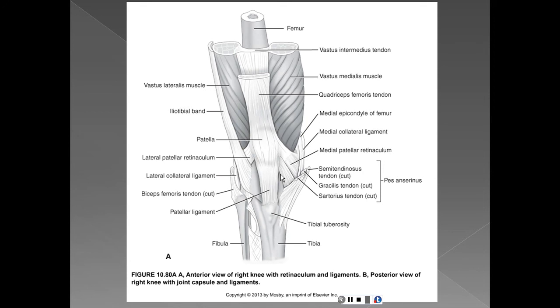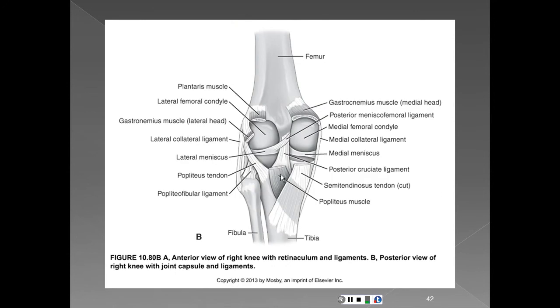This is the anterior view of the knee with the retinaculum and ligaments.